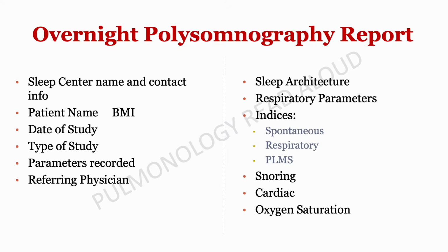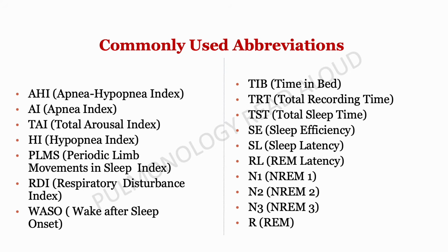The other thing that you want to ensure is that there are technical comments on the parameters that have been checked, and the physician's name. And yes, we'll be going through how a report is structured, so you'll have the second half there. These are commonly used abbreviations, and there are many more abbreviations also. But when you are reading the report, sometimes you may get confused between certain abbreviations, and it'll be important to have a note of it.